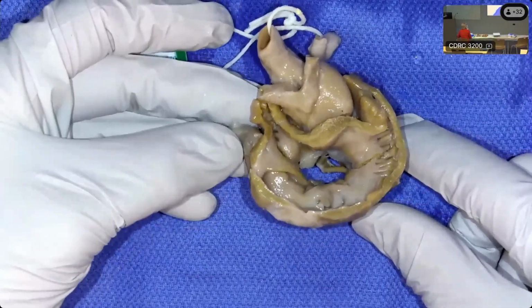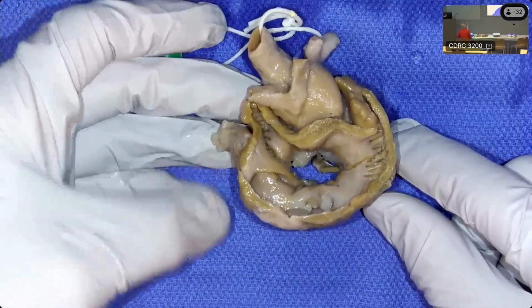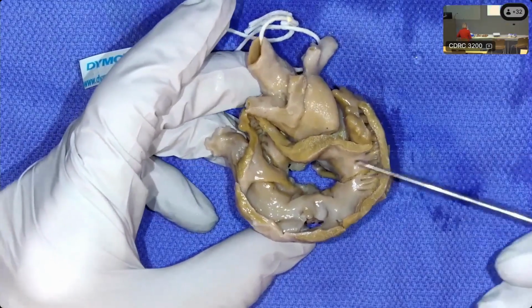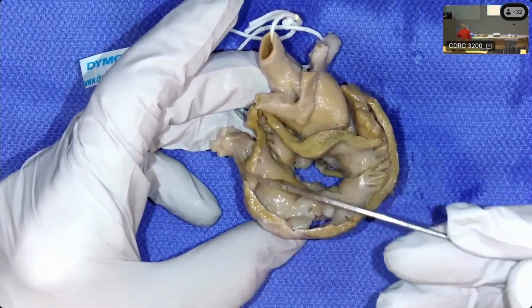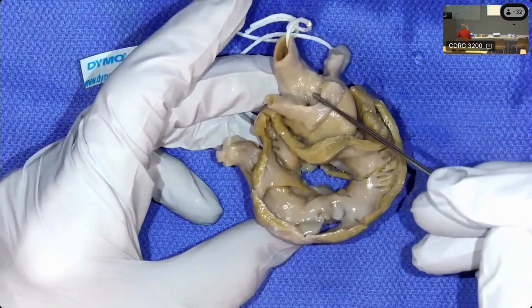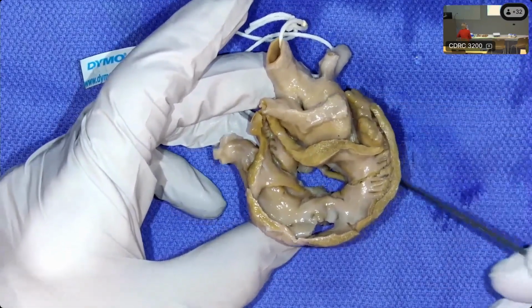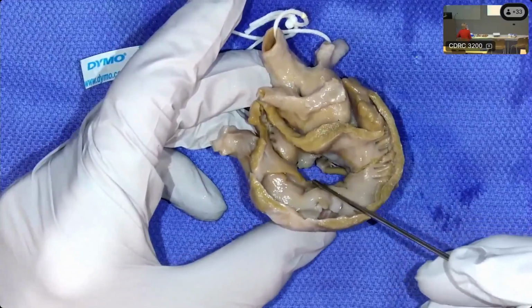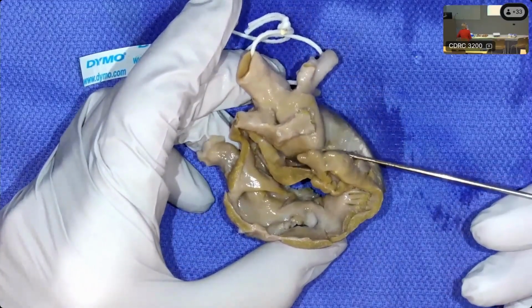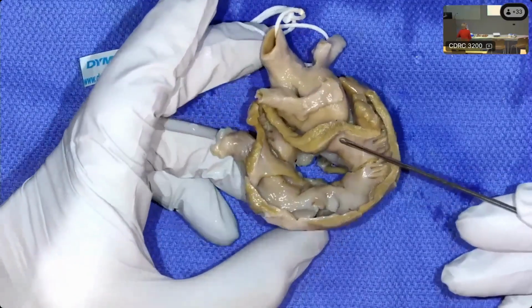As we reviewed with our morphologic characteristics yesterday, with our sequential segmental analysis, if we look at the appendages on this short axis view, here we can see the right pulmonary artery passing behind the aorta to the right lung, and you can see that there was a common atrioventricular junction. The right-sided appendage is finger-like with a narrow junction to the atrial vestibule.